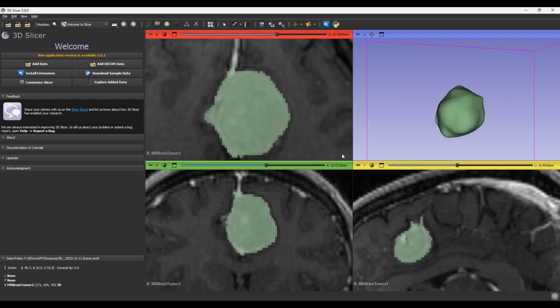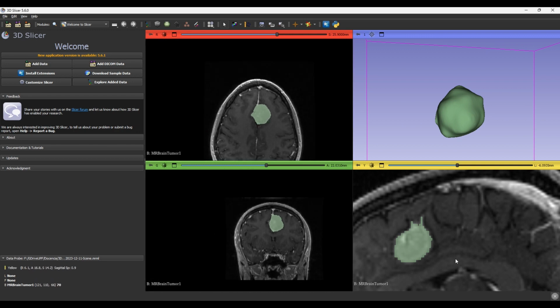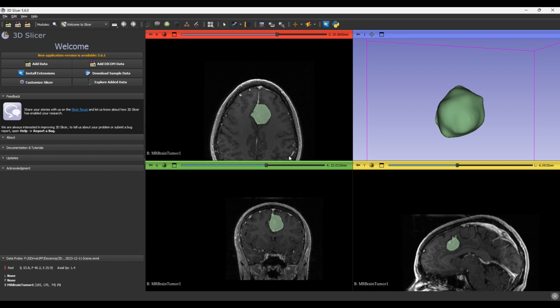This chapter is oriented to teach about extensions available in Slicer. Extensions are programs with specific purposes that can be loaded inside Slicer. Before installing any extension, save all the Slicer work, because extension installation requires restarting Slicer.